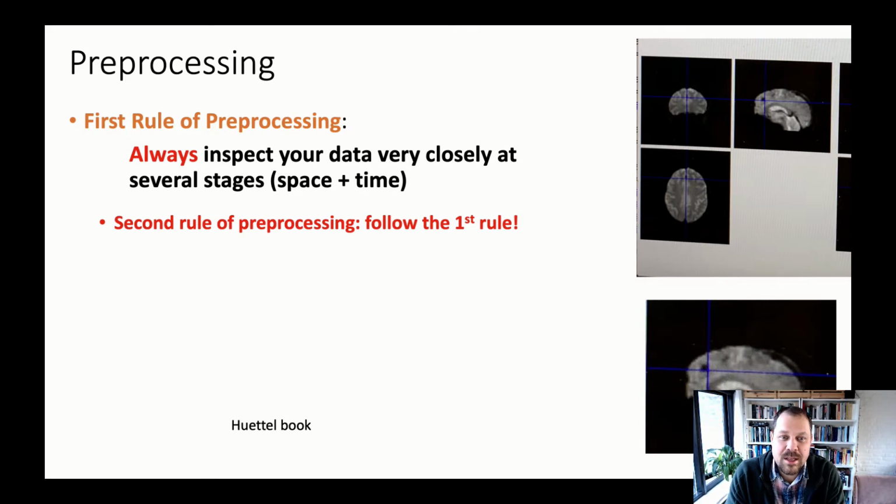The reason for this being that, in fact, sometimes we have data, and an estimated 10% of our data sets have this, where we have some artifacts that we might miss otherwise and then include in our larger data set. For instance, here you can see there's this sort of hole in the brain, a region in this brain where we have a signal dropout. And this could be due to many reasons. It's typically just a calcification, and so there's no signal here for this person.